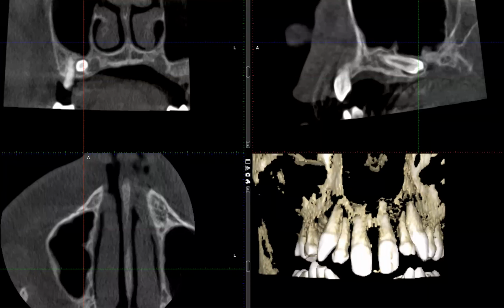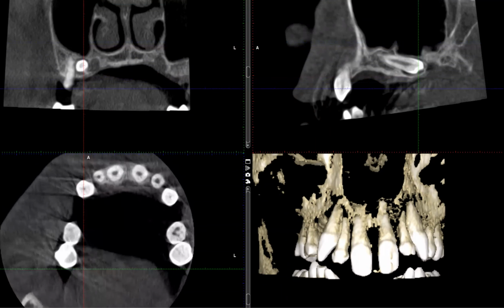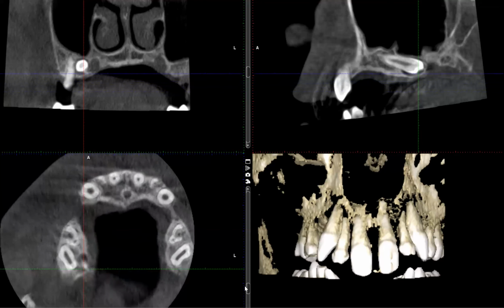This is Dr. Kim. So in today's video, we have a patient who is 14 years old and been diagnosed with a very unique condition, which you've already seen in the title. But let's find out some of the radiographic features that this patient has. So again, keep in mind the age is 14, and by that age, you should really have all permanent teeth come out by then, right?